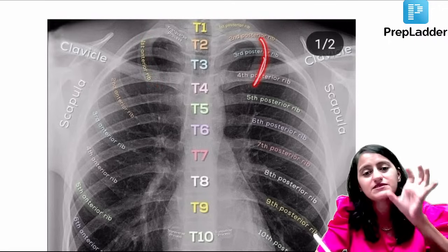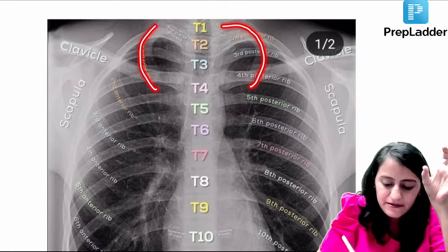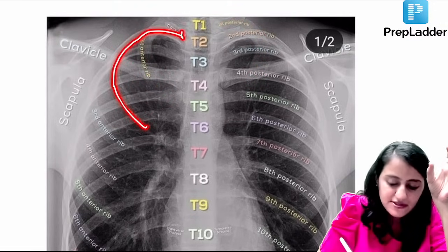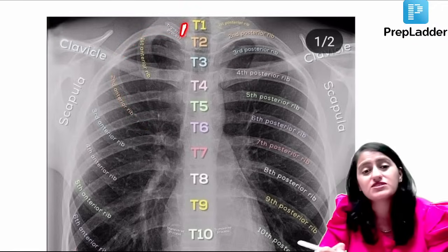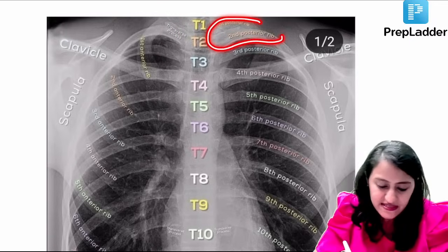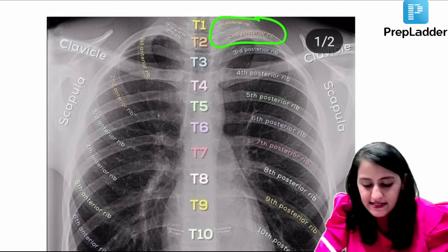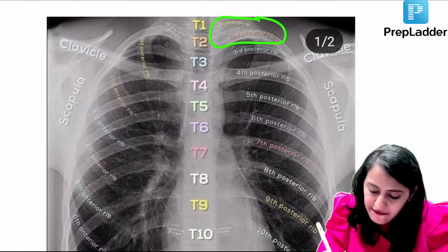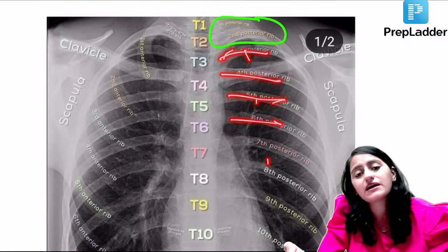The first rib is a broad rib. So you start counting from the first anterior rib and trace it backward. Second rib, you trace it backward. So you can see the first and the second rib are very close together posteriorly. This is where generally the mistake is made when you are counting the ribs. So understand that first and second are very close together. Then you have the third rib, the fourth rib, the fifth and the sixth, then the counting becomes easy.